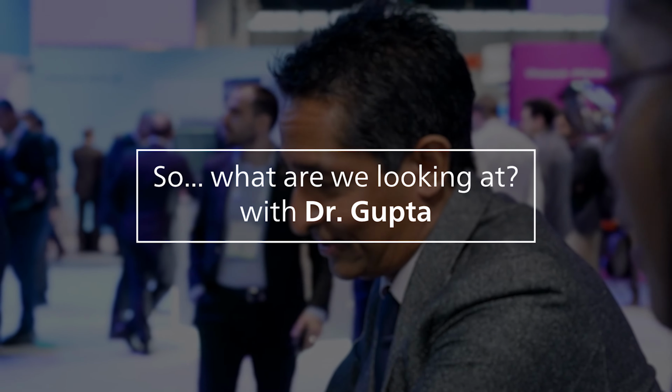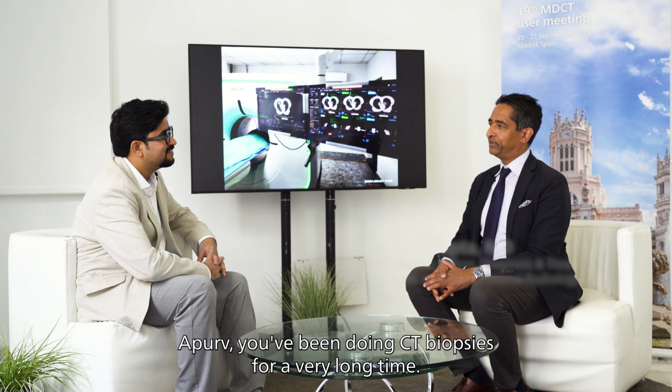So, what are we looking at? Apurv, you've been doing CT biopsies for a very long time. What were some of the challenges in the past? So doing CT biopsies, the most important challenge we face is needle guidance. Needle guidance and shortage of time. You have to do biopsy in between your routine procedures.